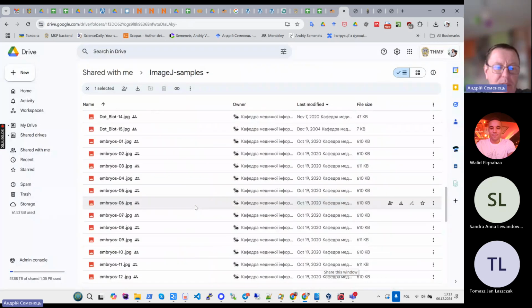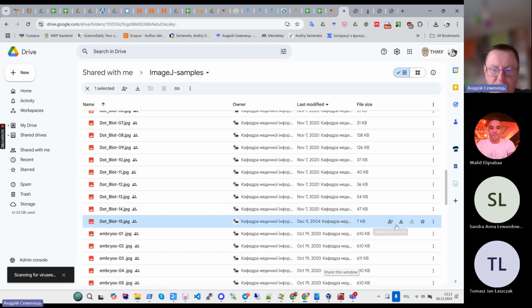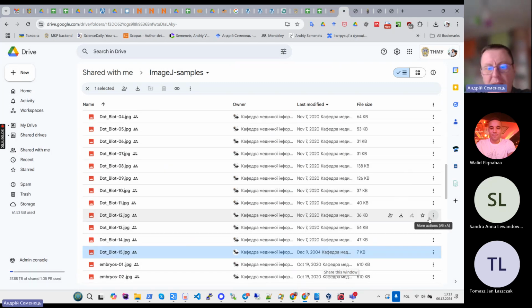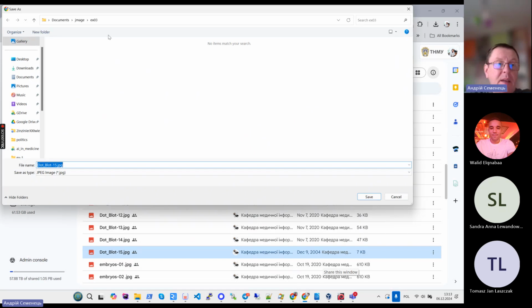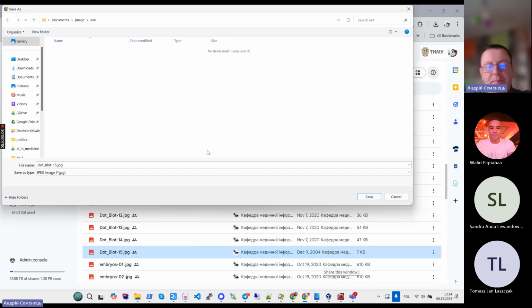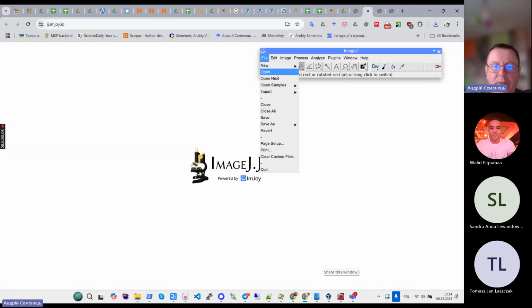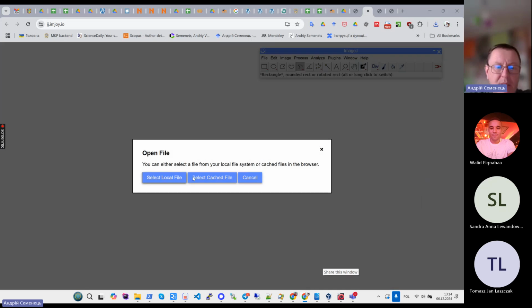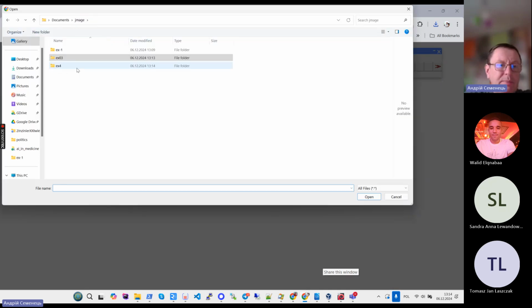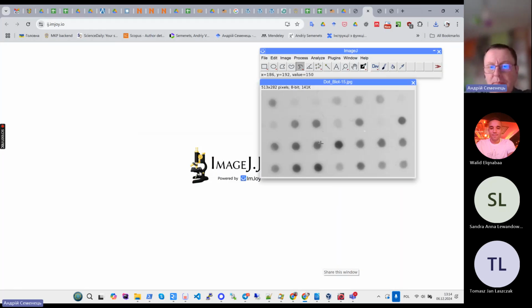Again, everybody will have different variants, so I will use again that one which fits the example, and you will have different ones, even sometimes easier than this one. Let me show this. File, open, select local file, open.